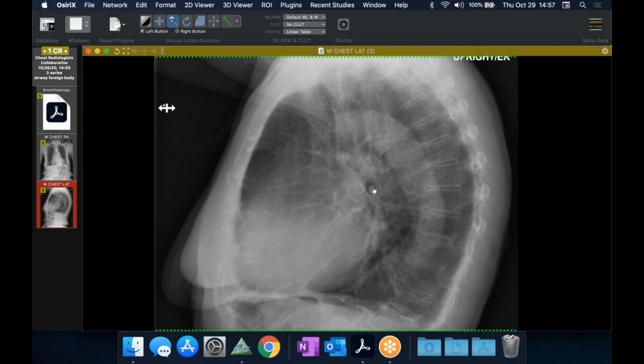Okay, and then my last case is just one of these eye test cases, which if I give you too much history, I'll give it away. But this patient came in the ED worried about having swallowed something. And you can see right there on the frontal view, there's this rounded opacity overlying the left main bronchus. And if I show you the lateral, you can see much better. There's actually a smooth foreign body where we'd see the left main bronchus here. So this patient takes potassium chloride pills to go along with her Lasix. So it's about the right size for one.